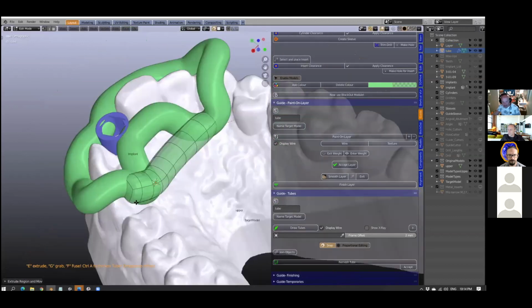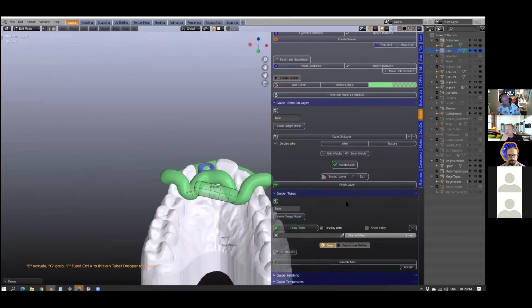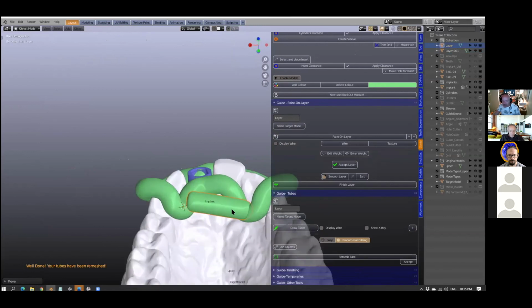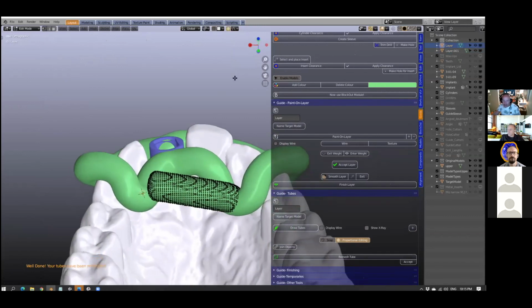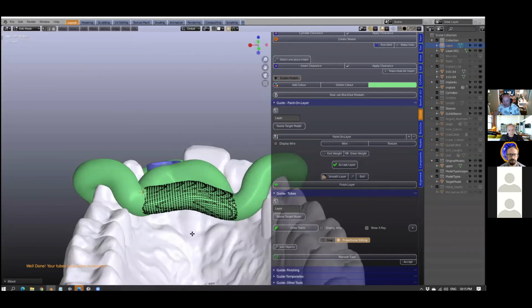So you can just add. Let's just move this in. Okay. And then I will click on remesh and then accept. And at this stage, I can go into edit mode. I can make sure the proportional editing is on, and I can use the G key, and I can just fold it into this tube if I want to, something like that.